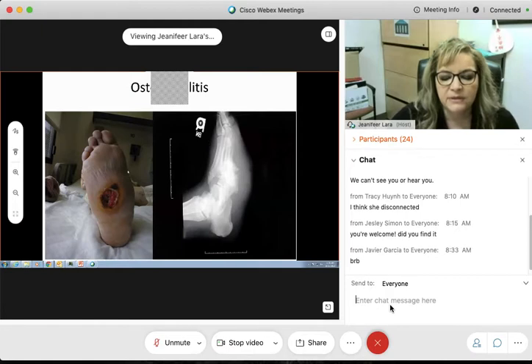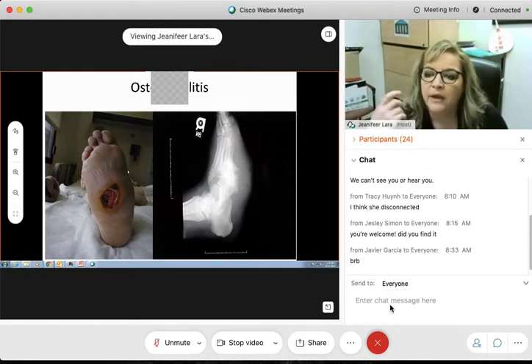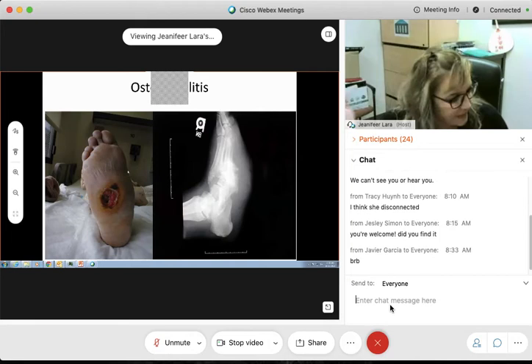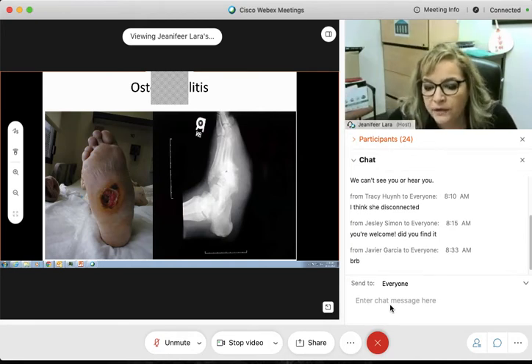And so what happens is, yes, this is an infection, and this is stemming from actual diabetes. So the patient may have hurt themselves, something, whatever caused trauma. The actual infection started to grow, and you can start to see on this radiograph that you're starting to see bone changes.